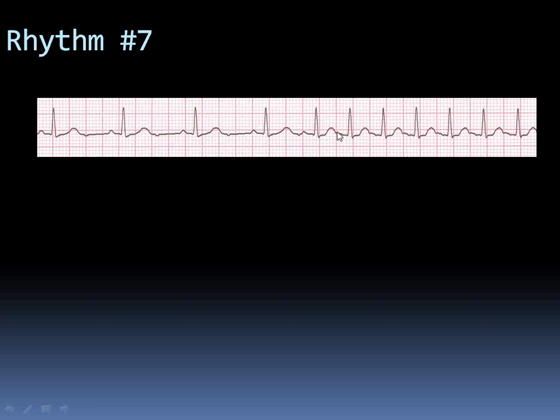When somebody comes in with an ECG like this, it is very important to see what his hemodynamic status is. If patients are hemodynamically stable, the first thing to do is a carotid massage. And sometimes a carotid massage is going to break this arrhythmia. Okay? So this is a rhythm strip of a patient having SVT, in which we don't see P waves very clearly, but we see QRSs which are regular, and the rate is almost 150 beats a minute.